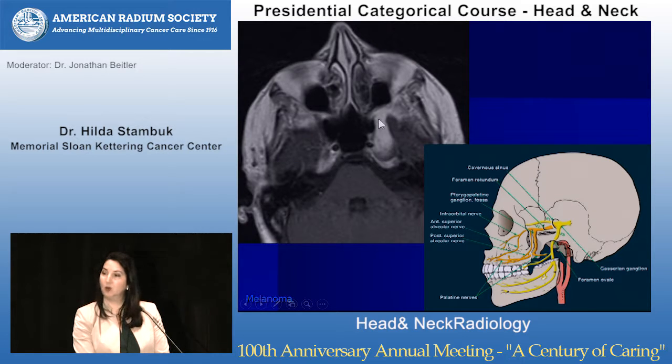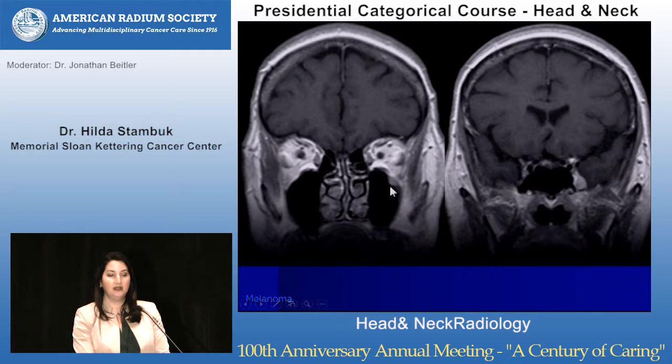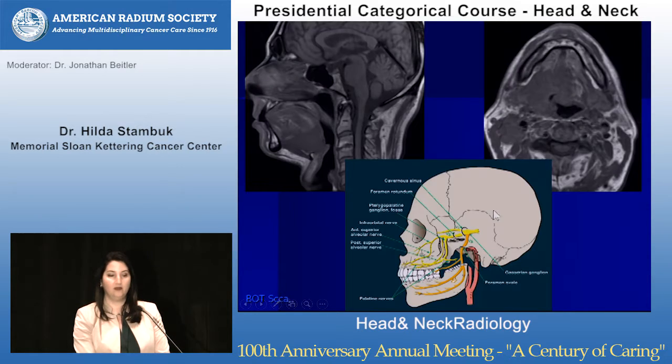You should see a little fat, a little nerve, a little vessel, but not this big trunk. Now I give contrast because I'm going intracranially. V2 is too big. Cavernous sinus too big. Meckel's cave too big. This is perineural spread of disease, and this is how it looks on coronal imaging, the infraorbital nerve. This is V2 in the foramen rotundum, absolutely too big and enhancing relative to the normal right V2.